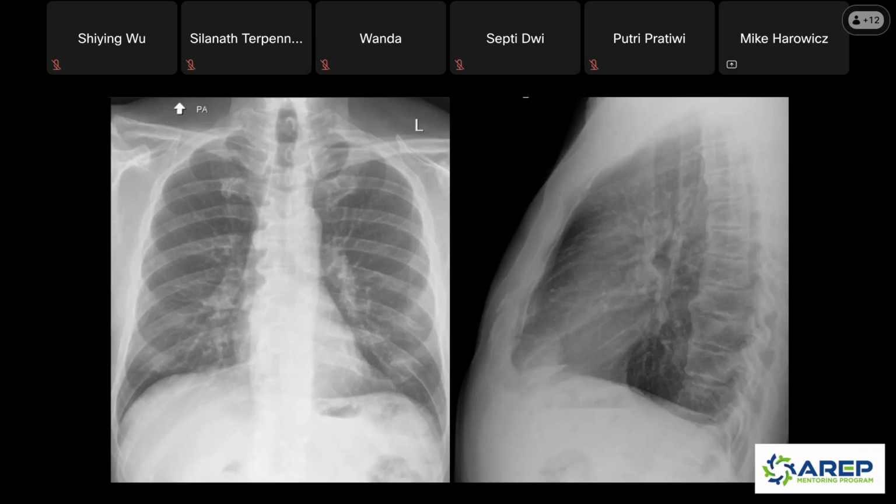All right. So let's start with the frontal. I've got to tell you, I don't see much on the frontal. I think it looks relatively clear. The lateral here is what's really helpful, and will draw your eyes back to the frontal, I think. So on the lateral, right, what do you want to look for on your lateral chest radiograph? Well, one of my big things is all the clear spaces, right? So what are your clear spaces? You have retrocardiac here, you have retrosternal, retrotracheal, and then we always look for the spine sign, right? The spine should get less dense going down. That all looks pretty good to me.